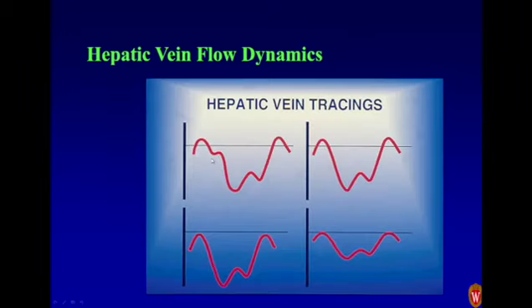So that waveform is key to see. Now, I'll tell you, you're not going to see the C wave very often at all. You've got to be very close to the right heart to see it. It dissipates very quickly, and you're only going to see it in a very small percentage of patients. Most of the waveforms you're going to see are like this. So again, 2 steps forward, 1 step back.